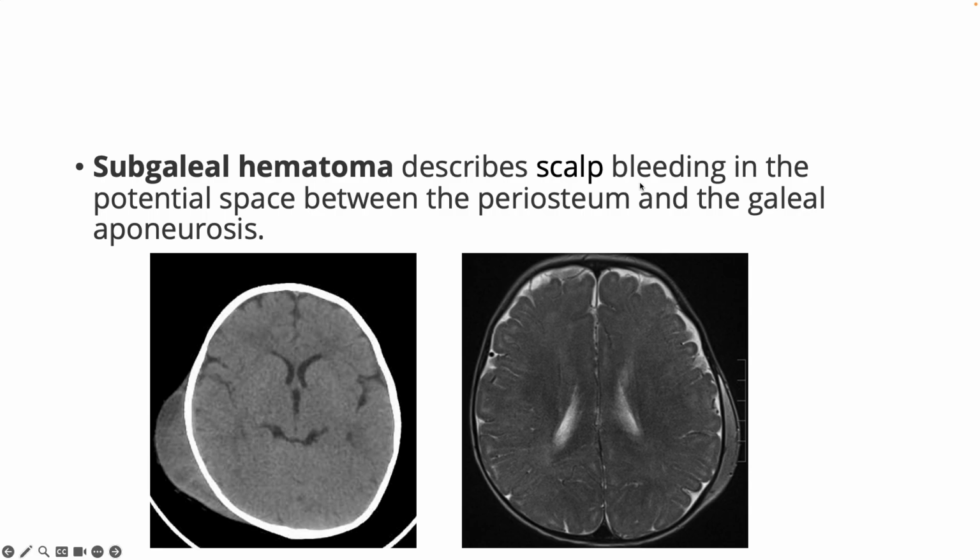Now let us see how it looks on a CT and an MRI, because the ABR exam is very image heavy and they love to ask diagnosis on different modalities. So we should know all the modalities for each diagnosis.